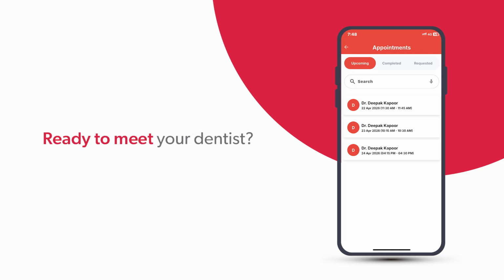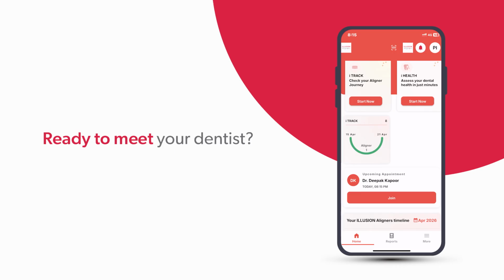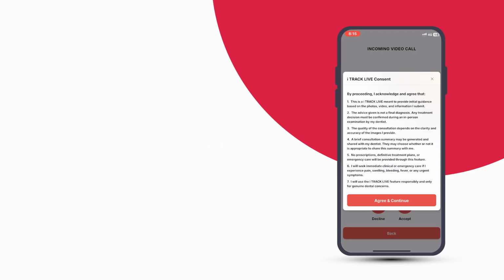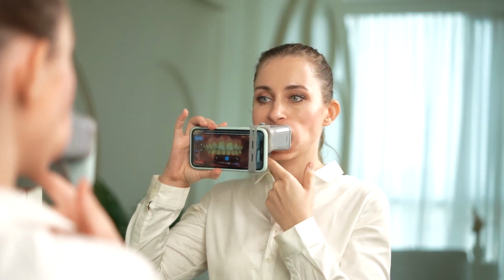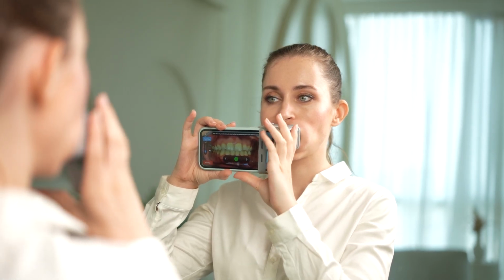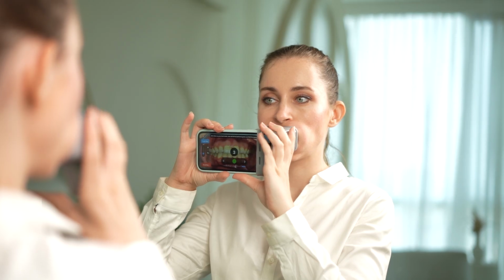To join the call, as per your confirmed appointment, click on the Join button on the home page. Click on Accept, and then Agree and Continue. Once the call has started, you can ask all the questions and discuss your issues with your dentist. Remember, this is not a normal video calling facility. iTrack Live is an AI-powered real-time intraoral video consultation, offering you everything you need to get successful treatment outcomes.